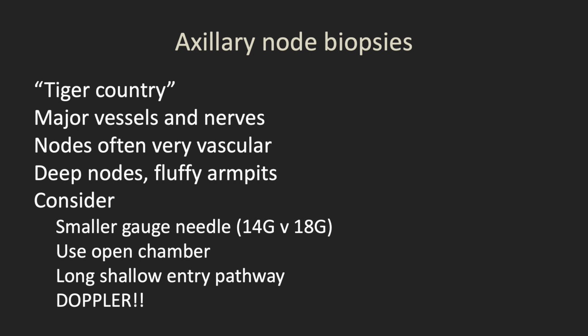These nodes may be deep. If you have ladies who are larger, they can be quite difficult to visualize, and quite difficult to visualize your needle. So some things to think about. You can use a smaller gauge needle, such as an 18 gauge, if you're really concerned about it. Consider, instead of deploying the needle with the spring deployment, going in with an open chamber. So you're having much lower risk of going into a vessel or some other major structure.